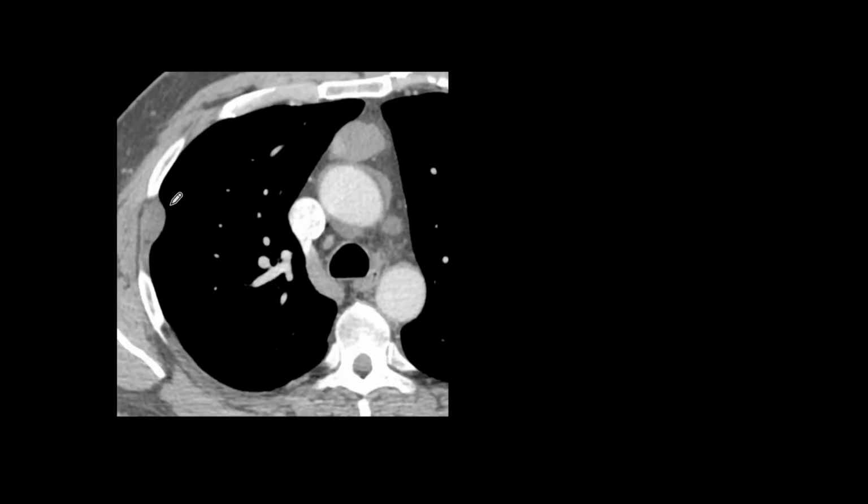And there in the CT, you see the lateral chest wall lesion, which happens to be extrapulmonary. It's a chest wall lesion. And then the second one, in the anterior mediastinum, was seen perfectly well on the lateral view and not visible in the PA. I made an excellent diagnosis in this case. The only problem is that it was wrong.